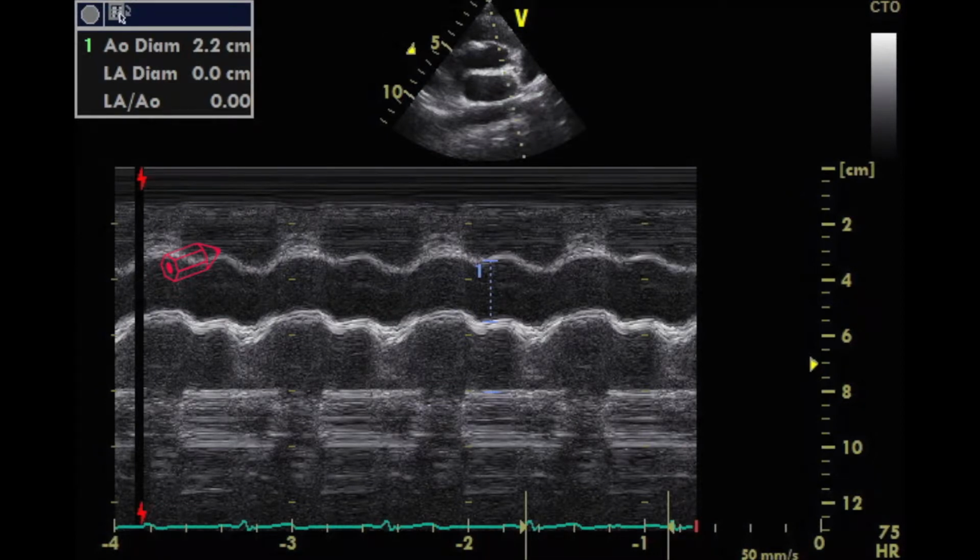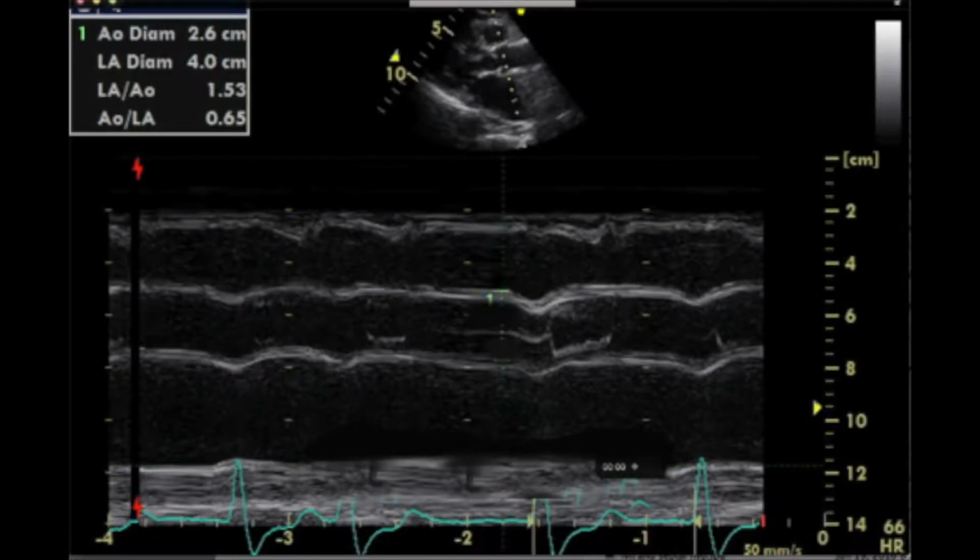Again, here's an M-mode depiction of the aortic valve with good excursion. It's moving very well because it has a strong ventricle pushing it. Here there's almost no sine wave. The excursion is very flat, and you know you have a weak left ventricle.